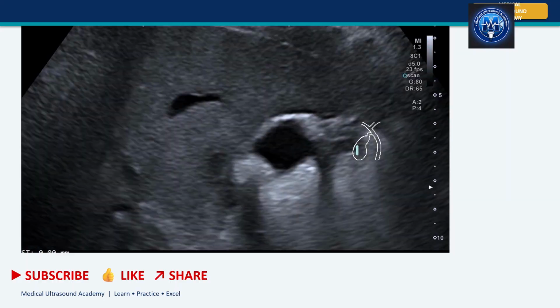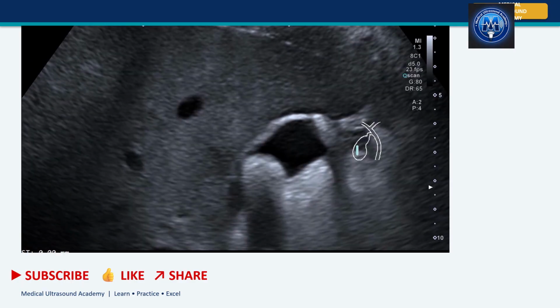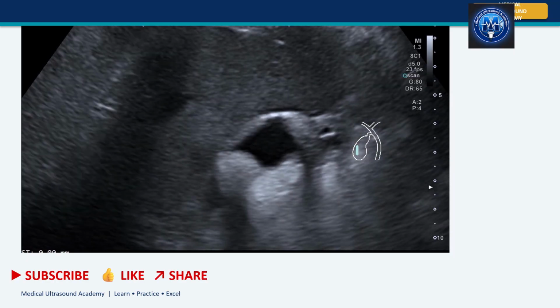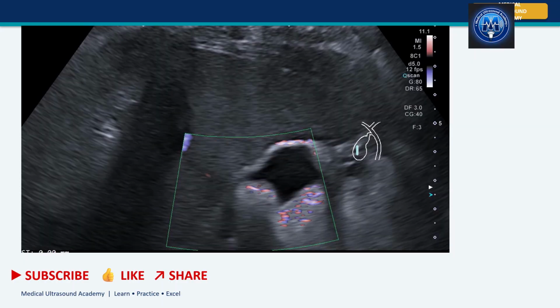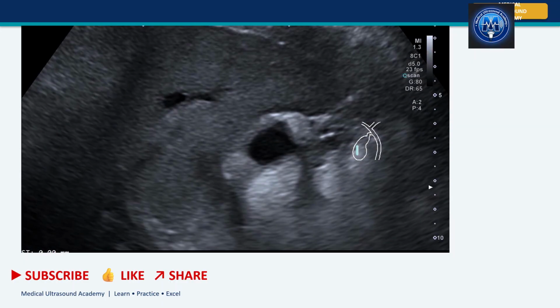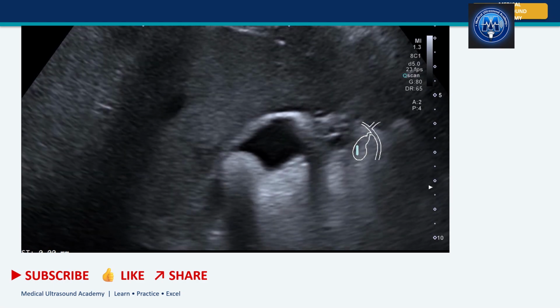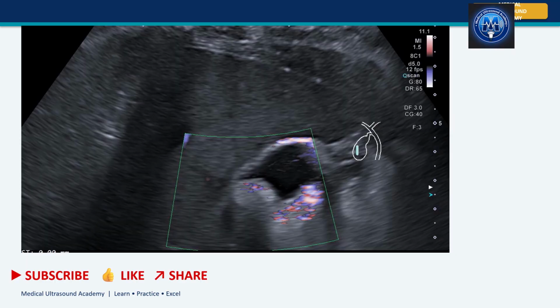So why ultrasound? Ultrasound is generally the first-line imaging examination for suspected gallstones. It has several advantages. It is non-invasive, does not use ionizing radiation, can be performed rapidly, and allows us to examine the patient dynamically. Importantly, we can change the patient's position and observe whether an echogenic structure moves. This dynamic assessment is extremely useful when differentiating gallstones from other gallbladder abnormalities.